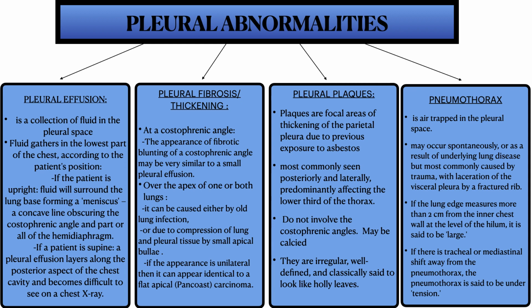I also want to add that if the appearance is unilateral, then it can appear identical to a flat apical mass, which we name Pancoast carcinoma.